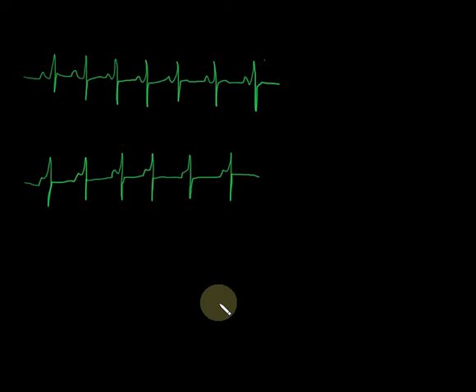Well, that's too close, and we talked through that in junctional rhythms and said that you can't get a beat starting at the sinus node to get all the way down to the ventricles in less than that roughly 120 milliseconds. If the rate gets really fast, you might be able to get by with like a 2.5 block PR interval, but you're not going to be able to with a slower rate like this. Again, we've got 6 beats here, so the rate's 60. Slower rate like this, you're not going to have PR intervals that are less than 2 blocks. It's just not going to happen without that beat generating from the junction. So this is the equivalent of our late P waves, and therefore that would be a junctional rhythm.